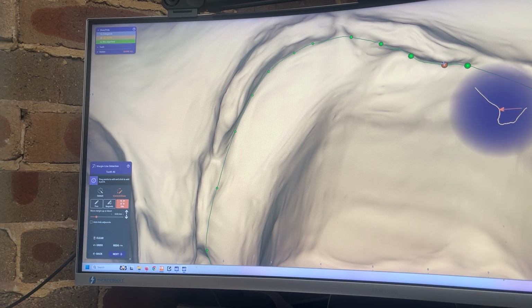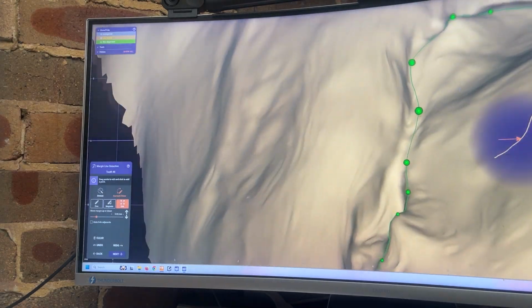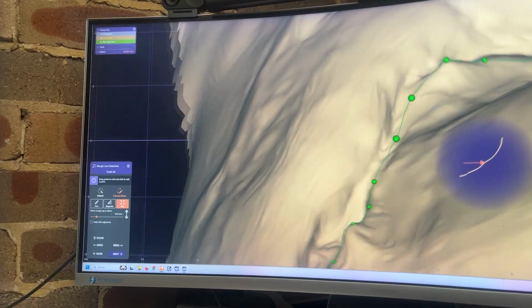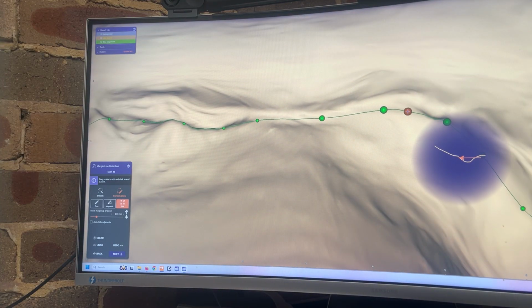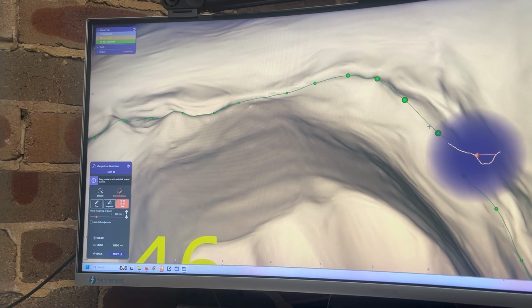There, and I think it's there. Move this out. There, have a look. No, I don't think it's there. Move it there. I'll move this out. So move it out here.